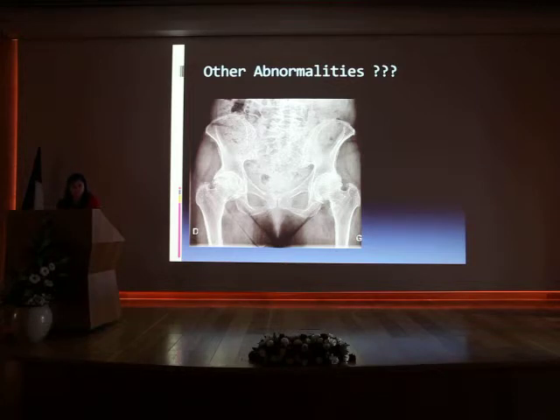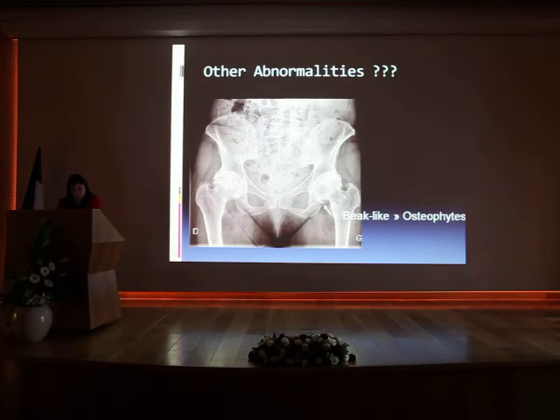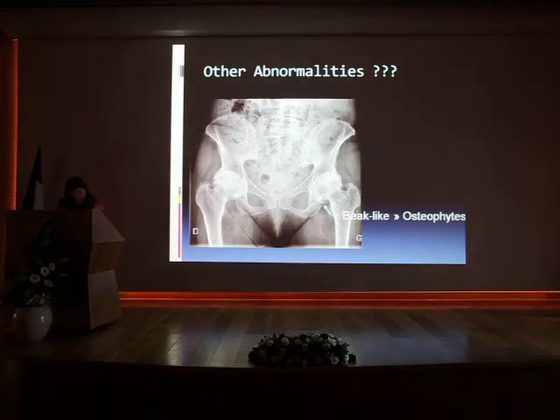Any idea? Okay, let's move on. Here we can see big, huge osteophytes, beak-like. And we can also see here a pseudo-enlargement here internally.